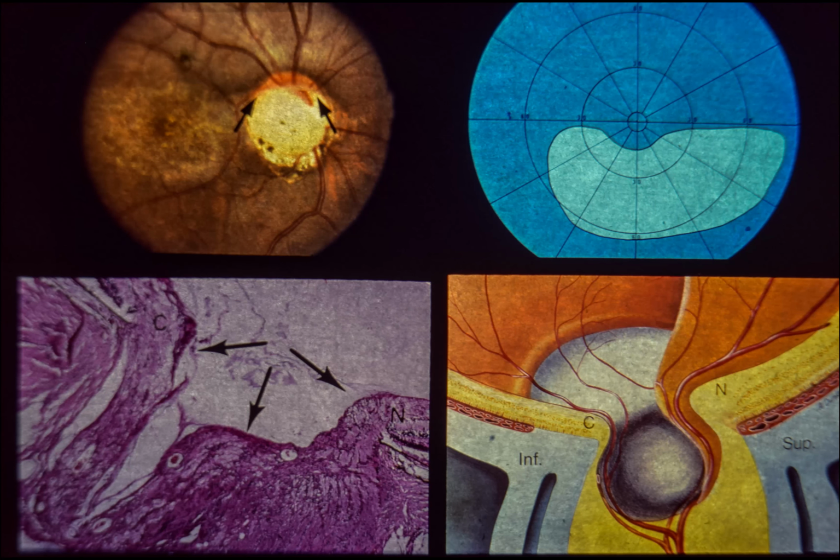Slide 49. Optic disc coloboma. This 24-year-old female had poor vision in her right eye since birth. Visual acuity was 10/200 in the right eye and 20/20 in the left eye. Upper left. The right optic disc is markedly abnormal. Normal nerve tissue is confined to a small superior wedge from which the superior retinal vessels arise. Normal nerve fibers can be seen in the superior region only.